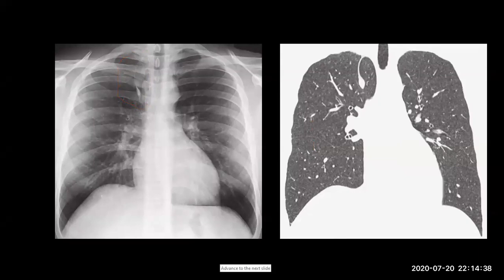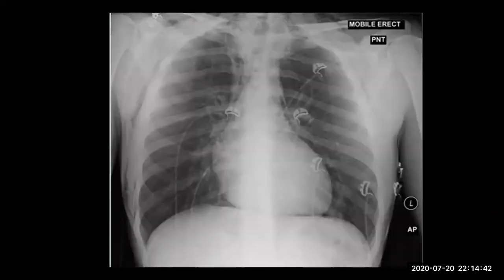Okay, we move to the second case. We need the findings. We need pneumomediastinum. Try to describe all the things. There is more than just pneumomediastinum. Surgical emphysema.